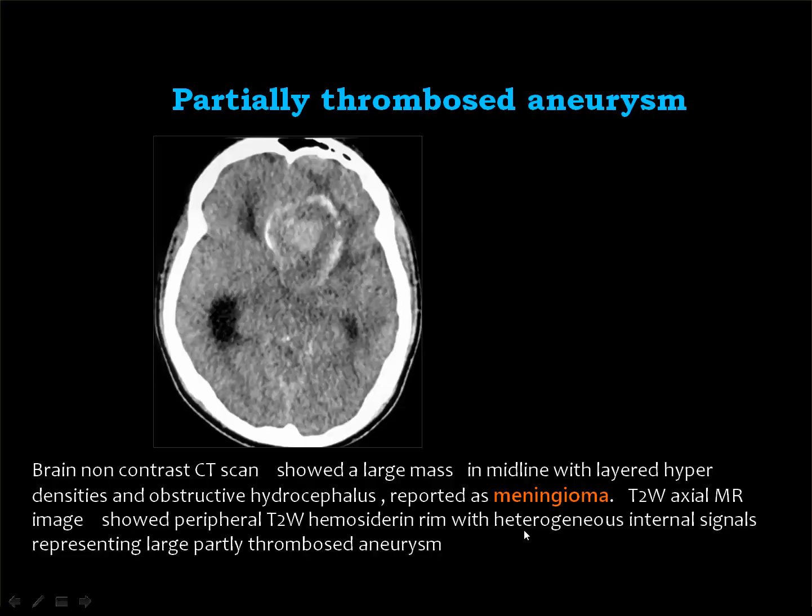And if you look here in this CT scan, this is a pre-contrast study, and you got a marginally calcified lesion, and this lesion was interpreted to be a meningioma.